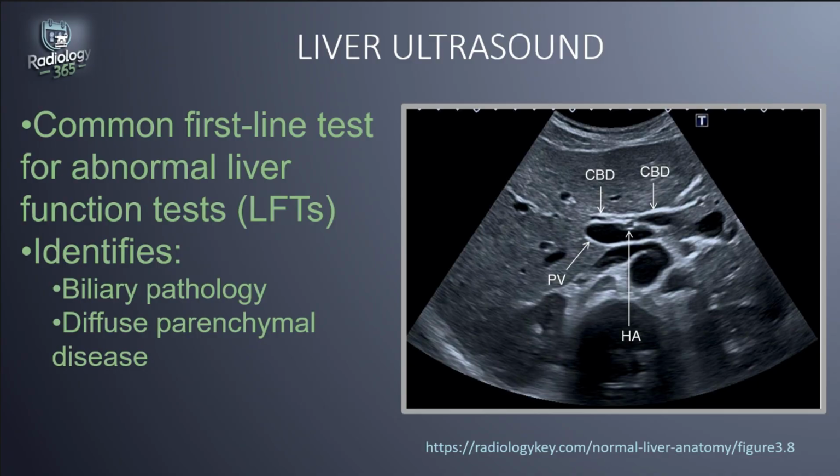I just threw in the gallbladder here because on normal liver ultrasonography we usually visualize the gallbladder. The common bile duct is also one of the things that you might see on ultrasonography of the liver and should measure less than 6 millimeters in its diameter.